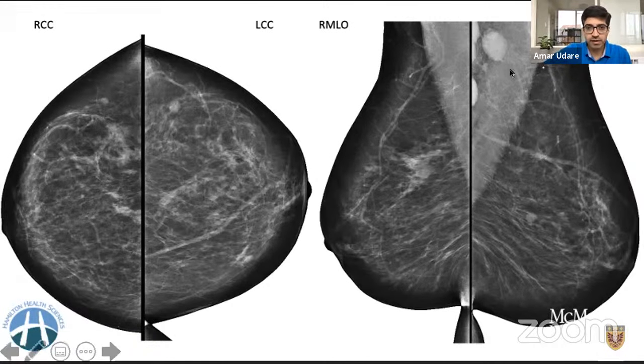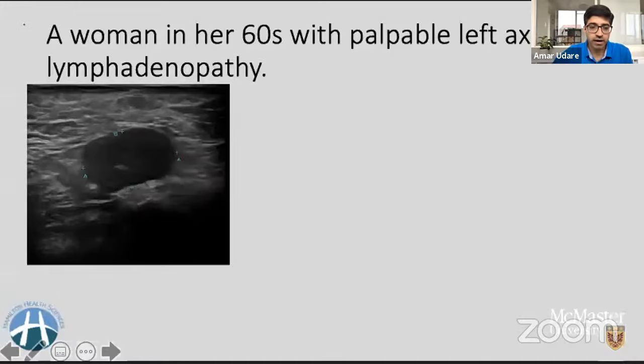So all you see in the left breast definitely is all these large lymph nodes in the axilla, and there is a circumscribed oval mass in the upper outer quadrant of the left breast. This was something which was assessed, turned out to be just a fibroadenoma. But anyways, this was the most concerning finding. So on mammogram, you definitely don't see any obvious evidence of cancers. You complete assessment of all the areas, you compress out this asymmetry, look at the circumscribed mass, and finish the assessment saying that, okay, there's no evidence of breast malignancy. So let's go ahead and do biopsy of the axillary lymphadenopathy.